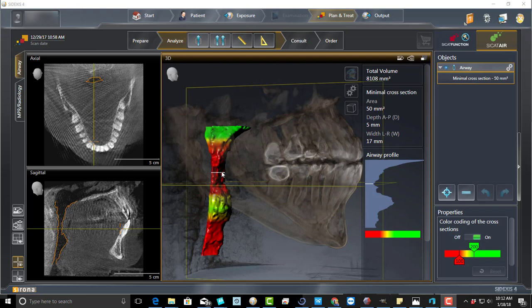Now, I don't ever diagnose, and even after I have my patients take a sleep test, even if that says there are sleep apnea events happening, I still have to take those results and send them to a sleep doctor, and they diagnose. I can't diagnose it, but this is a really good visual representation, something that the patient can see.